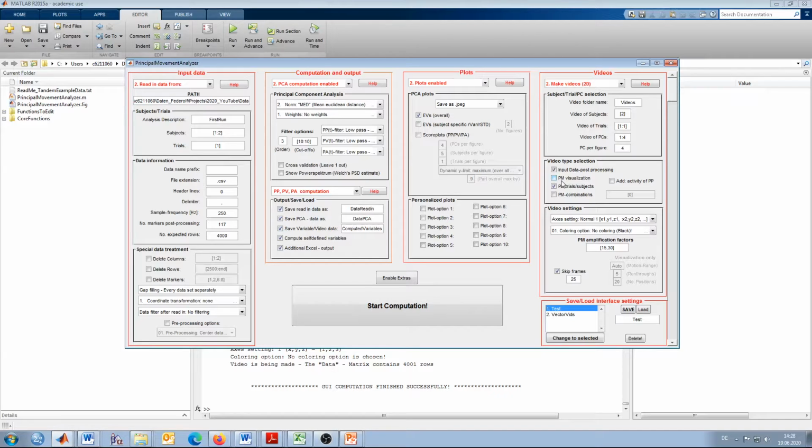It is only a sweep from minimum to maximum that was observed if I select this here. So this allows a very fast idea of what the movement represents, but it does not represent the accurate timeline that we can observe. For the moment I will only use this one, so I will show you specifically the second subject and the first trial, how that person moved.